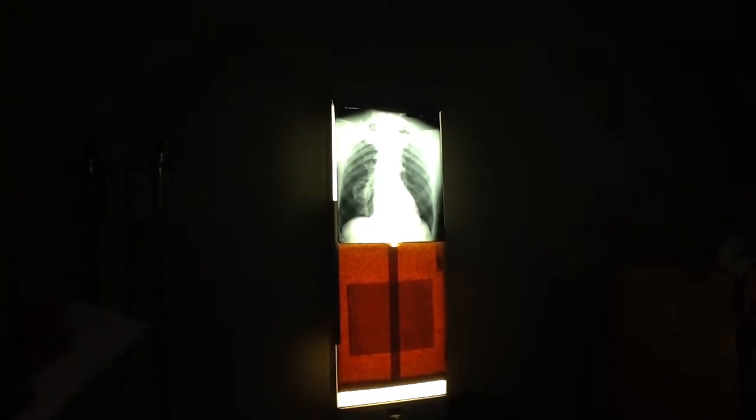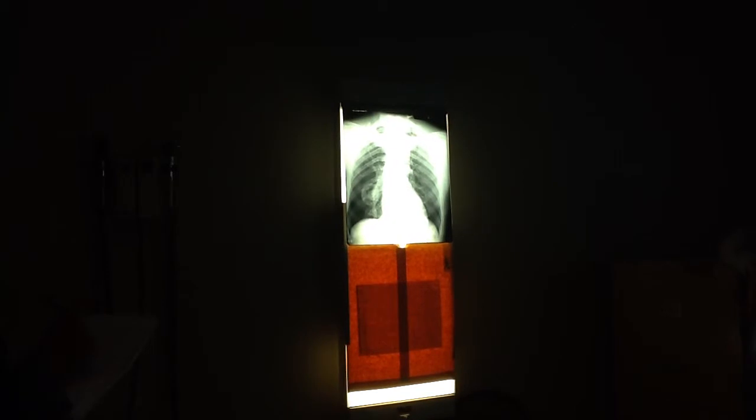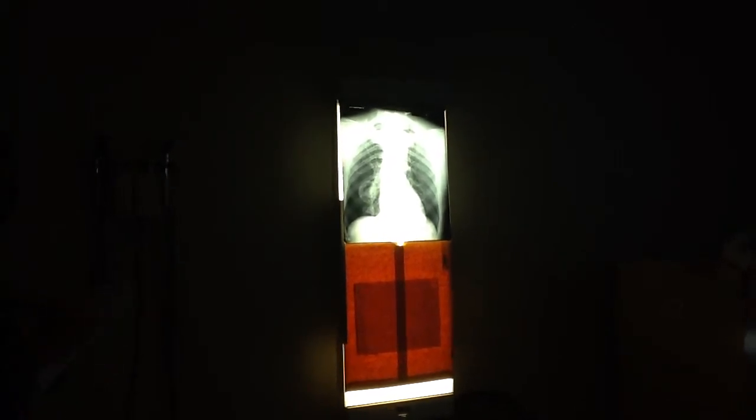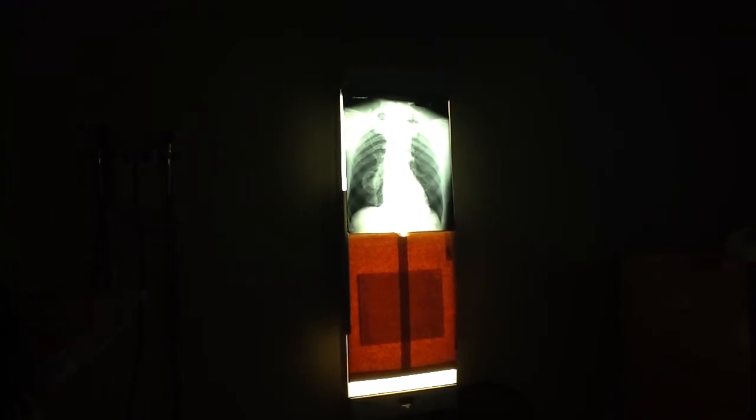Yes. Is it subsegmental, segmental, lobar? What would its distribution be? Subsegmental, exactly. Remember, if it's segmental, it has to be the entire segment. So if it's less than the whole segment, then subsegmental is anything from really tiny to just less than the whole segment. So that's a subsegmental density, circular to oval, well-defined outer border.